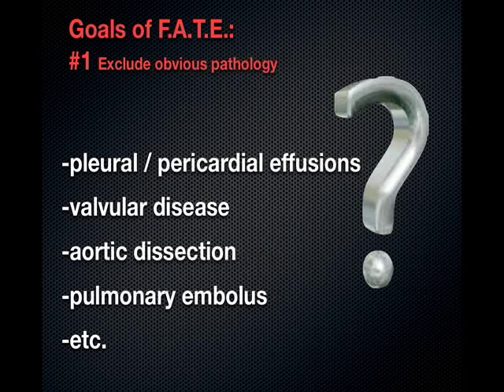So back to the goals of FATE. Number one goal was to exclude obvious pathology. These are things such as effusions, obvious gross valvular disease, dissections, which are rare to find on point of care ultrasound, but we should look for them anyway. Pulmonary embolus.